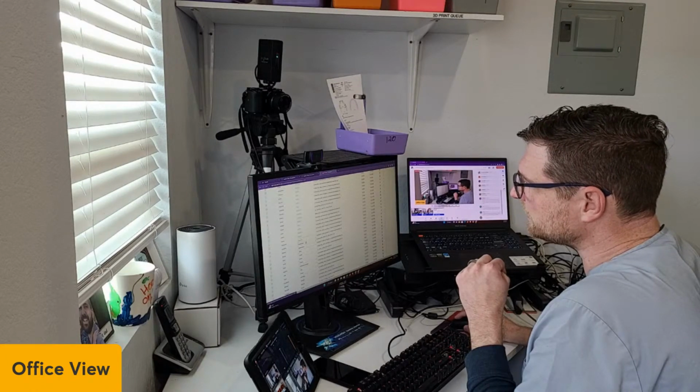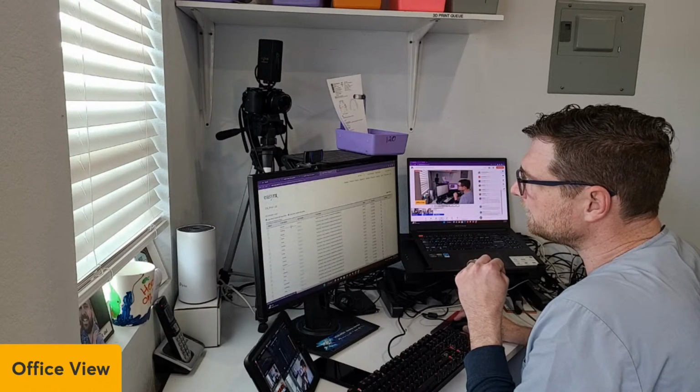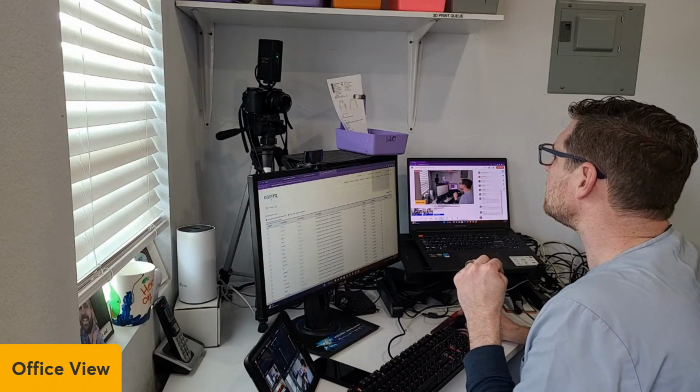I don't think I need to go down this far, but I'm probably going to be choosing one that is way down there. So let's do that. All right. So let's turn that off because it messes with my eyes.